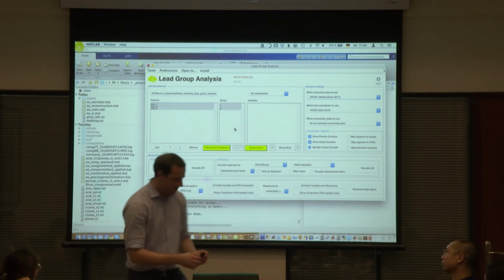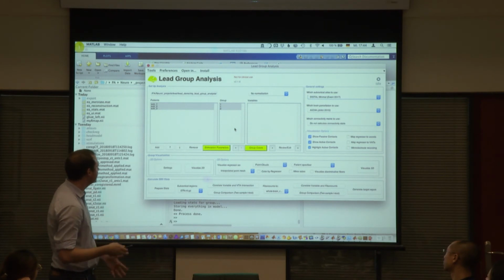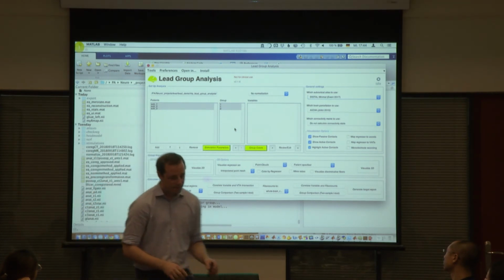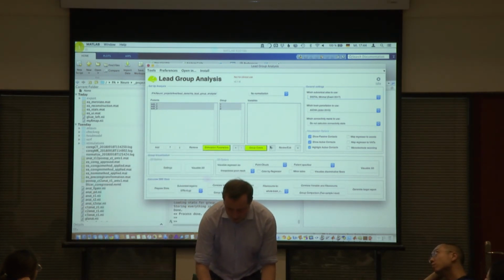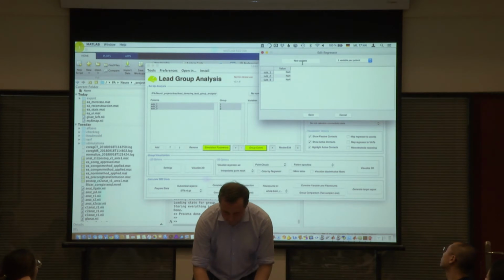So we cannot do a two-sample t-test here, right? You probably agree it's not enough samples, but what we can try to do is a correlation, and we add a fake variable here, which we'll call, again, improvement.